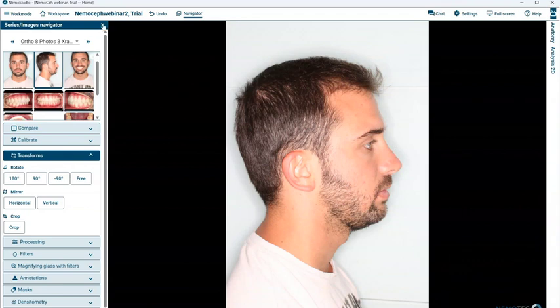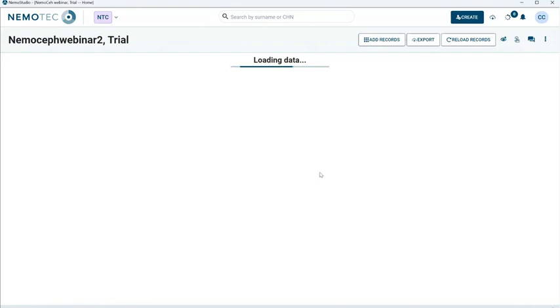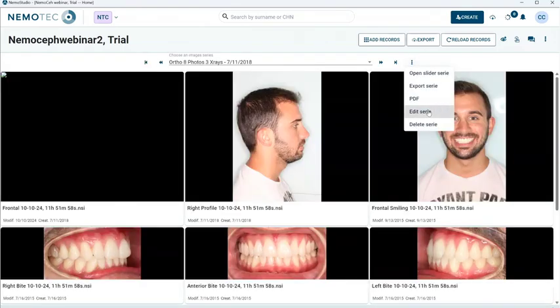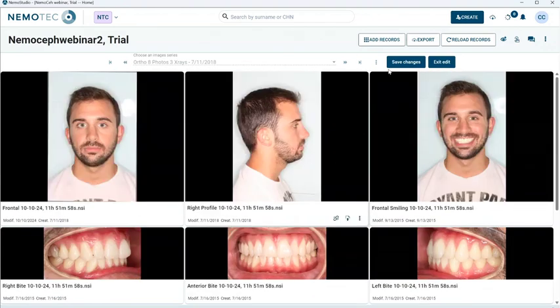Okay, then when we are finished, I may also click on edit series and do the edition directly from this panel.